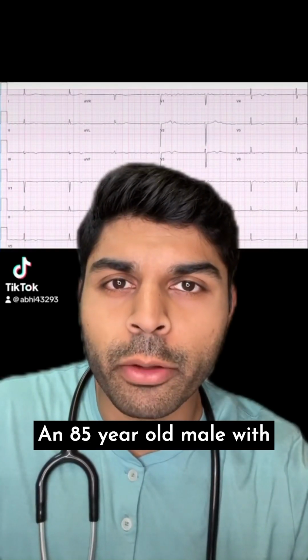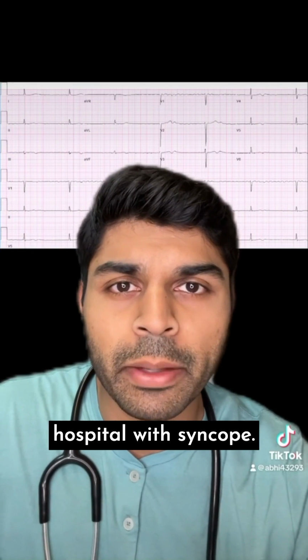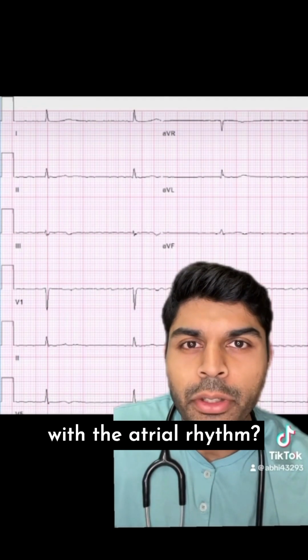An 85-year-old male with coronary artery disease and prior coronary stenting comes into the hospital with syncope. This EKG is obtained. Let's learn to read it like a cardiologist. First, what do we see with the atrial rhythm?